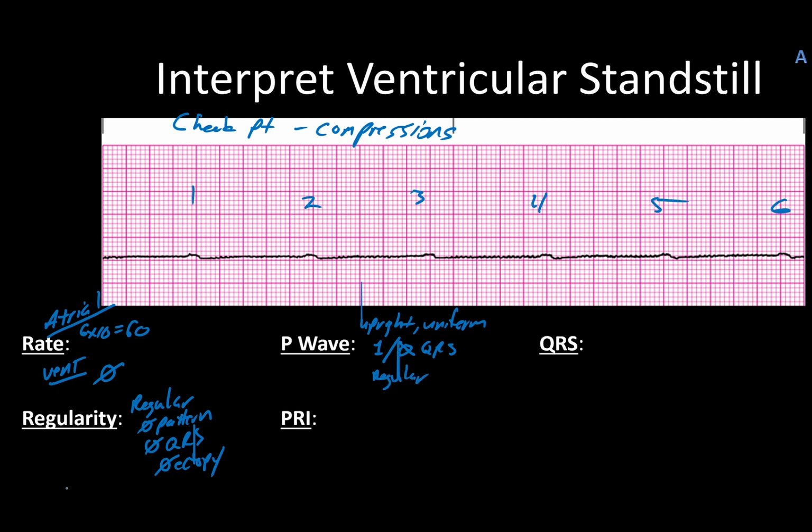You can kind of eyeball it to see that they are. But if we go ahead and measure these out, I really don't think there's a good pair to measure between. Comes out to about 25, and that marks out accordingly.